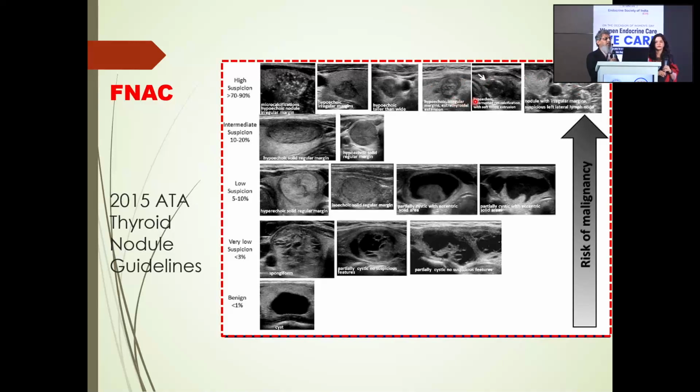And here is an example of something which is tall, and so basically it summarizes all the things. As you go from bottom upwards, the TIRADS score would go up, and I think this is just a pictorial picture for someone to look at and try and mix and match. So that is how it goes.